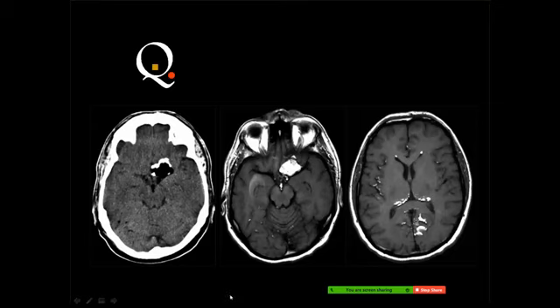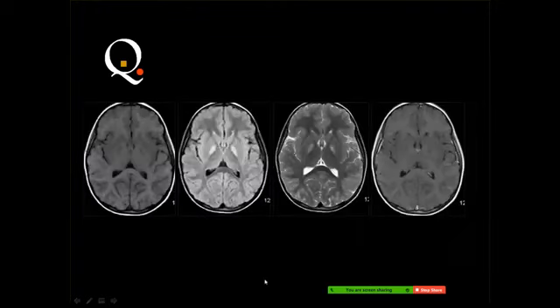Dermoid. Yes, and you should say fat seeding. Yes, with leakage in the subarachnoid space and maybe inside the ventricles as well. The lesion showed fat density in the CT with marginal calcification, and it shows high signal in the T1, denoting the presence of fat. And you can see also fat globules scattered throughout the subarachnoid space.